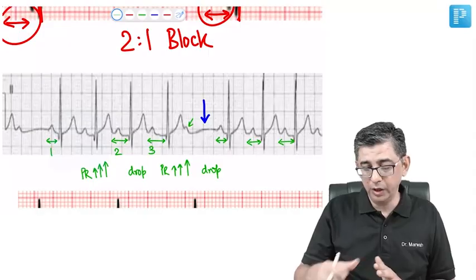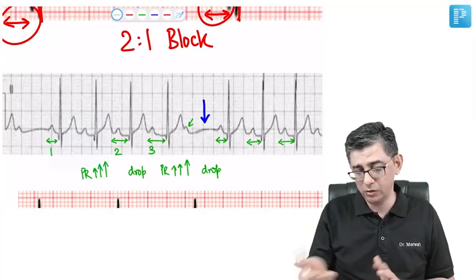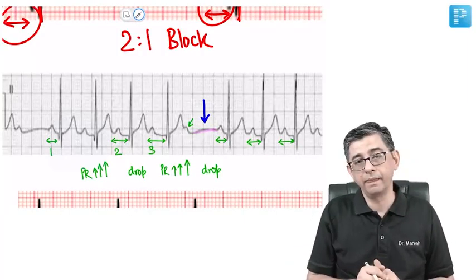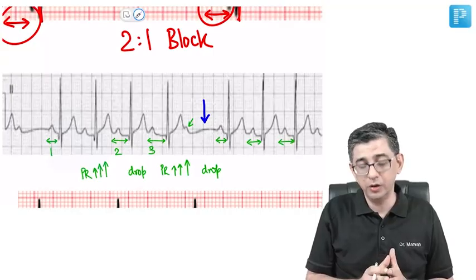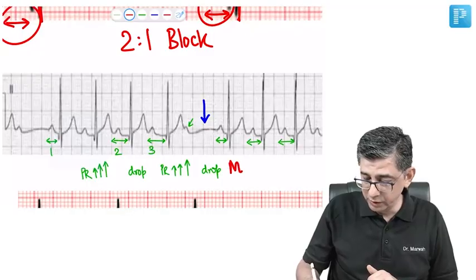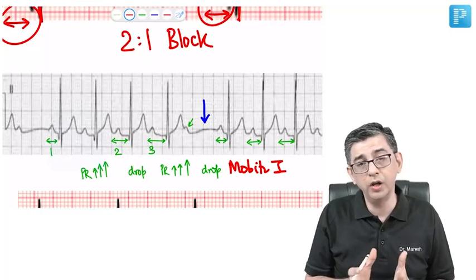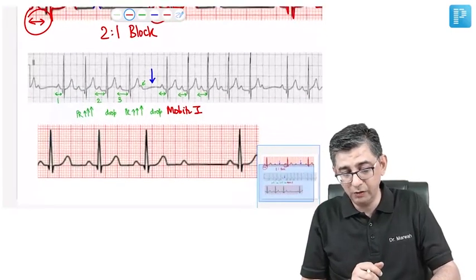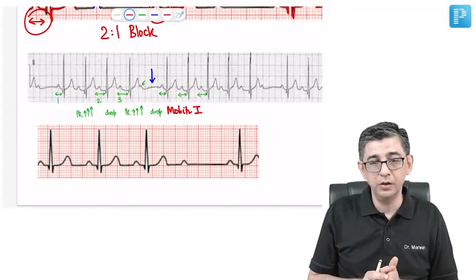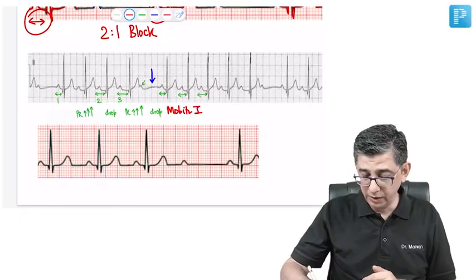The vertical arrow, if given in the exam, would usually point towards a vertical black arrow like this. Even if he does not put a vertical black arrow, this looks like almost a sinus pause, so you have to evaluate what's really going on in this patient. This ECG, which is currently in focus, would be answered by you as Mobitz 1 heart block. Or in the MCQ, instead of saying Mobitz 1 heart block, he might actually say intranodal. Why intranodal? Because the problem is inside the AV node, therefore it fails to conduct, and therefore after P there's no QRS complex.